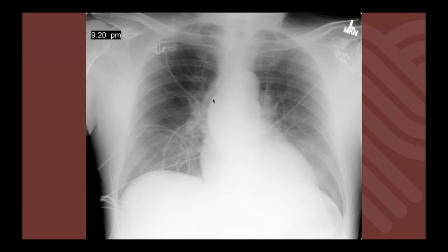Now you can actually follow the lateral contour here, the right lateral contour of the aorta, over the rest of the cardiac structures. Usually it's all the same white density. We don't follow the specific borders of the structures in the cardiac silhouette, just the contours, but not internally, not within the mediastinum. So this was very apparent. It's not just a bit prominent, but it's very, very bright, and you can see it very well all the way almost to where you would expect the aortic valve to be. So I hope that's projecting well on your screens.